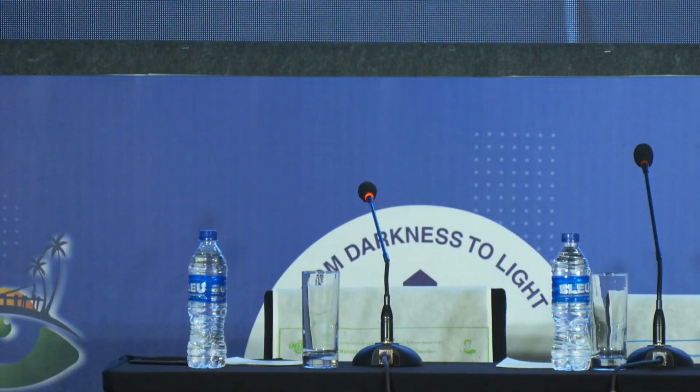So can I have the first slide? Right, so I thought we could understand the OCT and look beyond the colors. Our fundamental take-home message in the next hour or so would be clinical examination is key. Red is not glaucoma, red may not be disease, and green is not normal. So at the end, I hope we'll all understand what to order, when to order, and why to order.